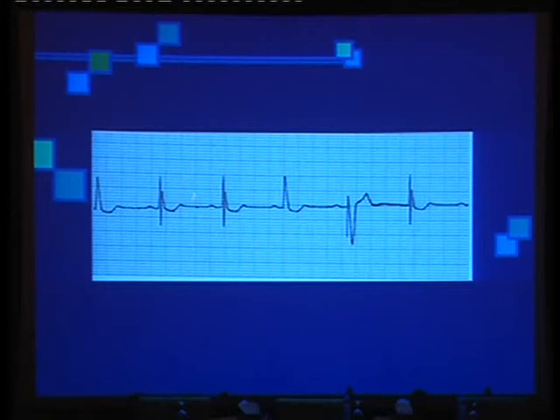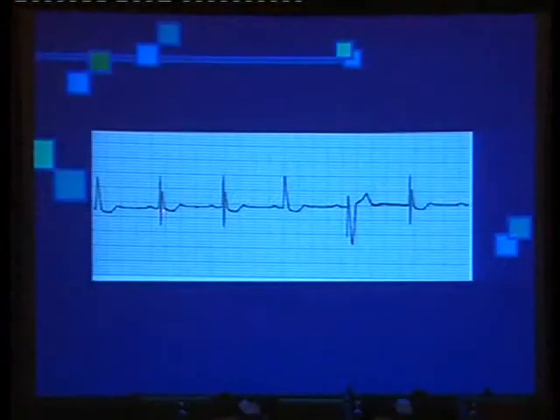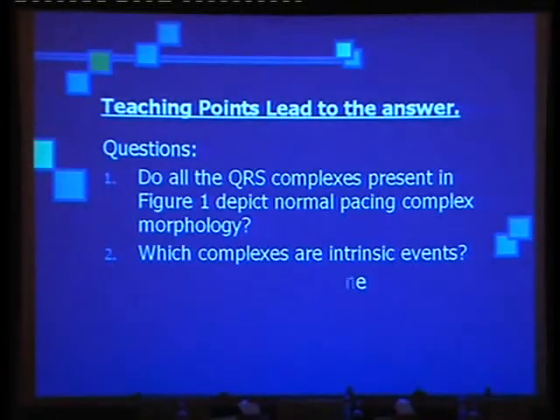In the pseudo fusion beat, the T wave is the same as the native. In the fusion beat, it looks the same, but the QRS is different compared to the capture beats. So here, we don't need to do any corrections. In case you need to do corrections, we may override the pacing, we may pace above the intrinsic rate, but this is going to deplete the generator because we need more power. But the proper way is that we usually program the pacemaker lower than the intrinsic rate. Okay? I will skip the questions because I have only 5 minutes more.